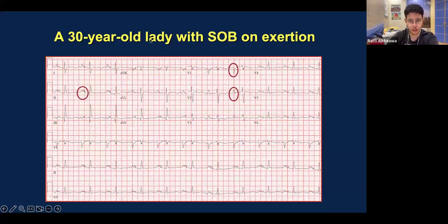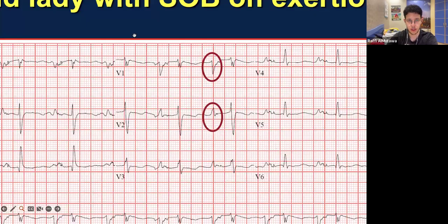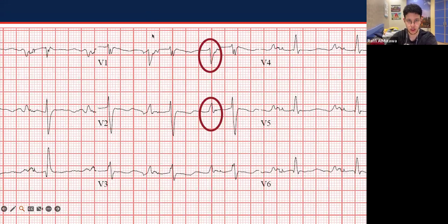The rule of thumb, or the advice I would give here is, when you see a camel, look for the mountain on V1 or V2. If it's not clear, I'll repeat. I don't mind.